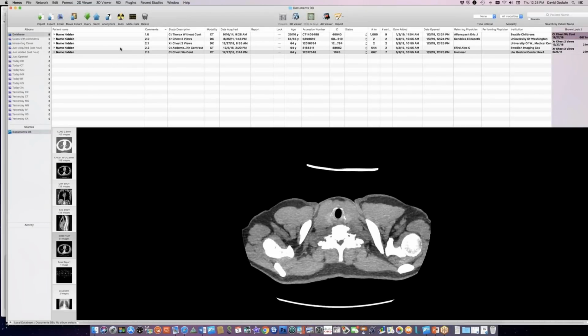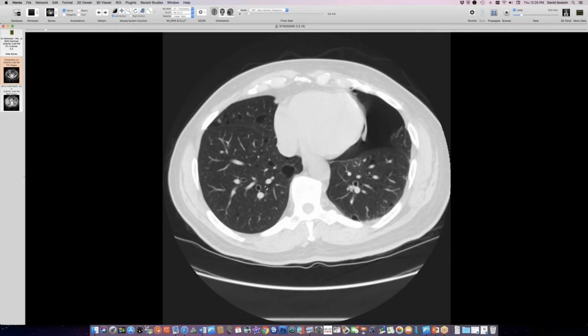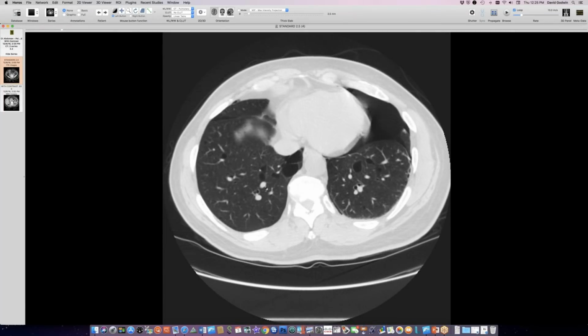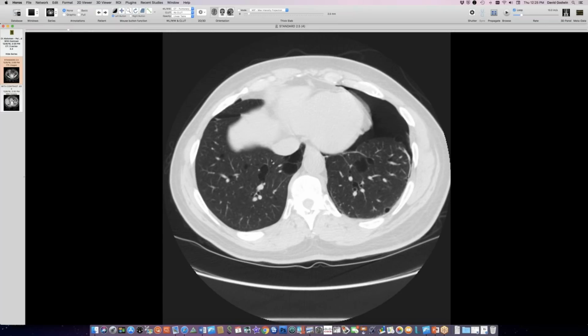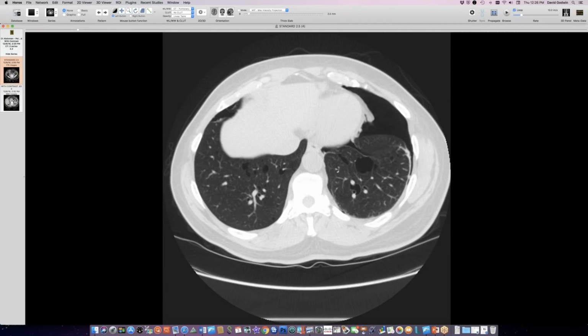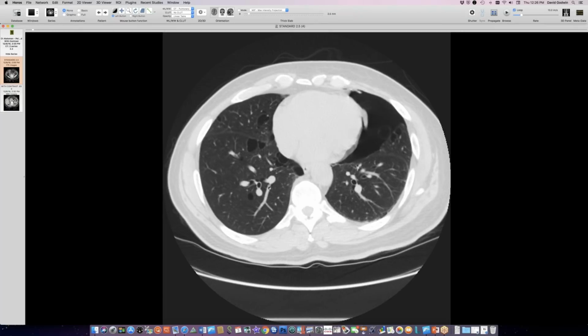But here's a CT of the abdomen on this guy that revealed the pneumothorax, and it also shows the reason why he's got a pneumothorax. He's got all these holes in his lung. They're pretty discrete. Some of them are elliptical, like this one I think is elliptical, and it's also perivenous. Some of them are along edges, like along fissures, and these are along fissures too.